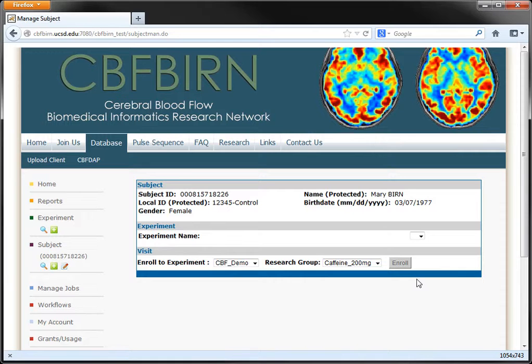In the previous tutorial, you'll remember that we covered how to create projects and study conditions. This is where we associate the subject we just created to a specific project and study condition. Here we will assign the subject Mary Byrne to CBF_demo project and control for the study condition.